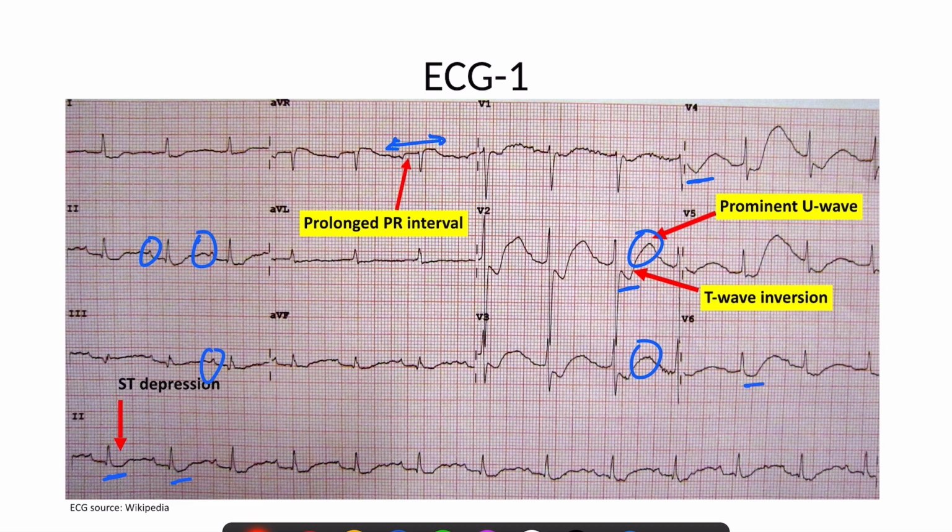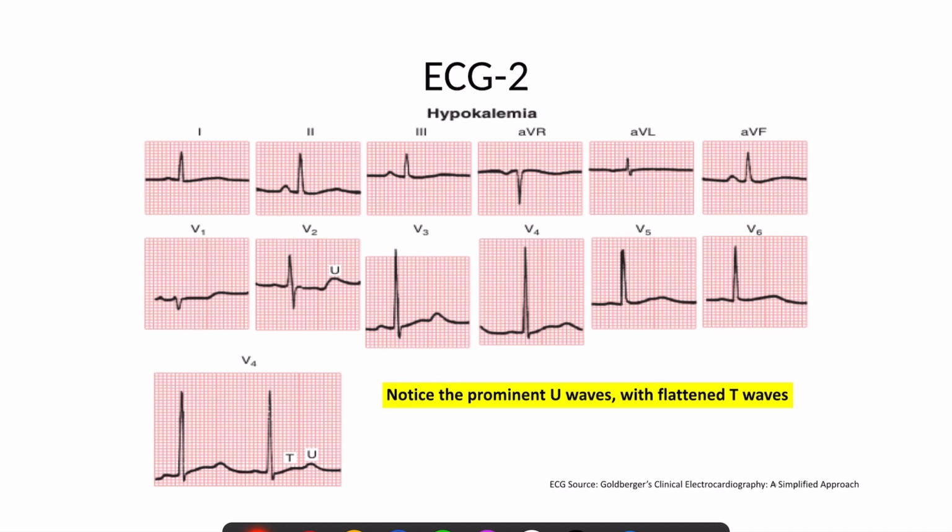So these are all the findings suggestive of hypokalemia, and we should remember all these findings to understand the ECG changes in hypokalemia. Now moving on to the second ECG.